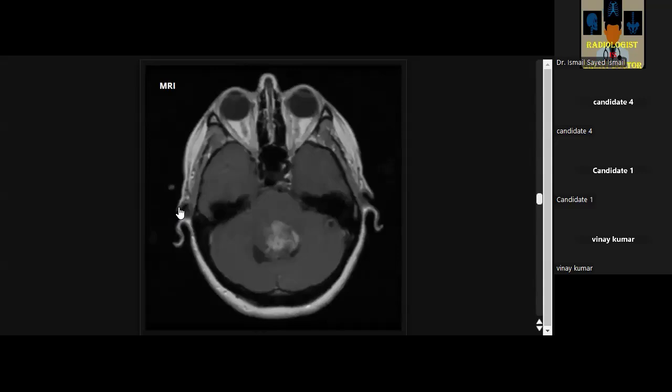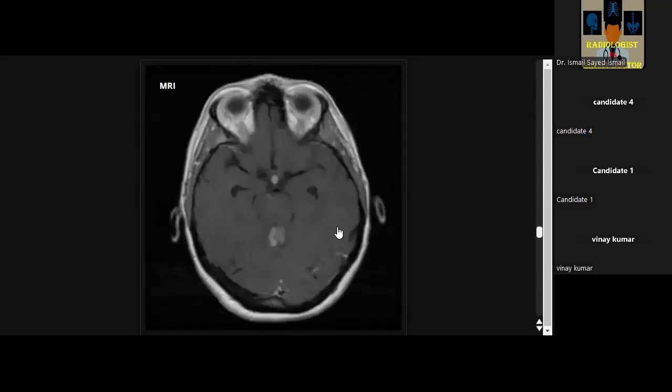And now tell me what to do. Okay, I can't scroll. Okay, I can scroll now.